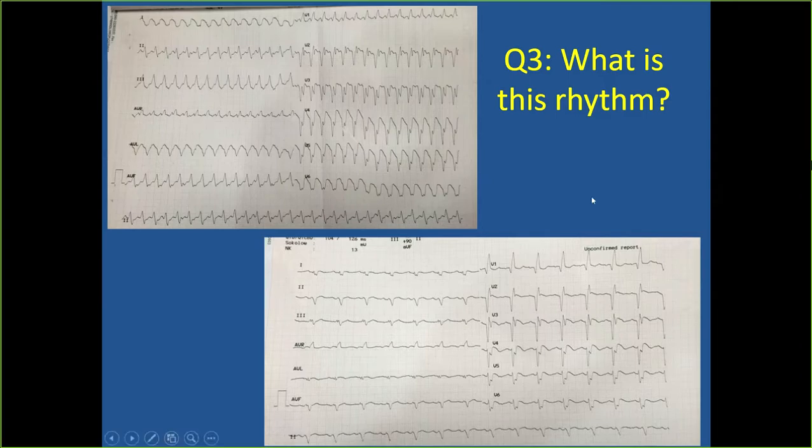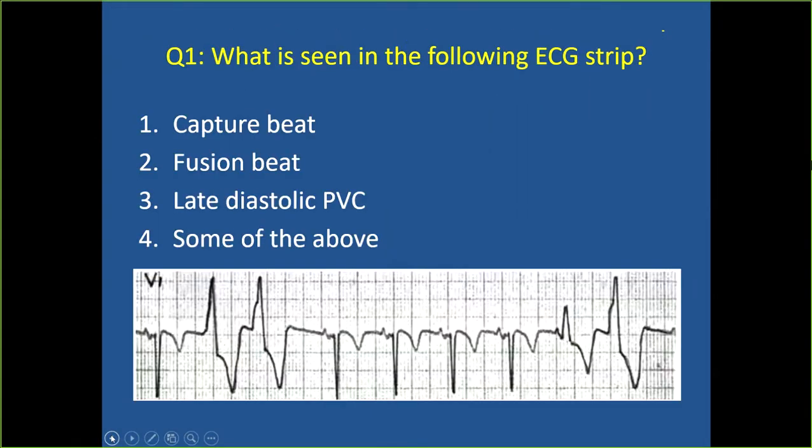Why is it just going? What is the rhythm? No, this is not the question. The first question is different. Deepak, just go 2 questions back. Let us do that. This is the first question, sir. Please stick to the questions.